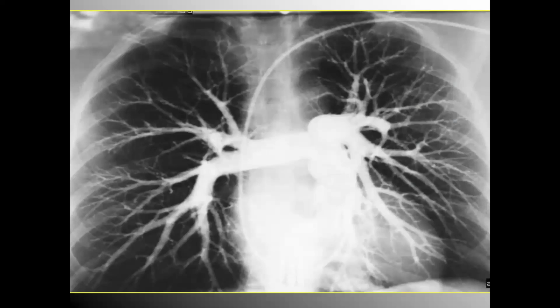So the tendency is to mostly focus on the lung fields when interpreting a chest X-ray. But certainly there are many clinical implications of prominent vasculature. When you see blood vessels that are easily seen, even prominent, if you will, and they are much different than what you would see in a typical patient, that usually means that they have some type of problem.